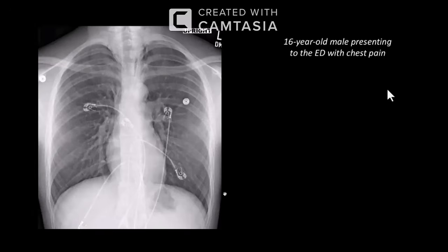Apart from that, the lungs appear to be normal. There is no evidence of opacity or any mass lesion seen. The costophrenic angle appears normal. I'm looking at the bones. The bones grossly appear normal. No evidence of fracture. So in summary, this is a case of pneumomediastinum.